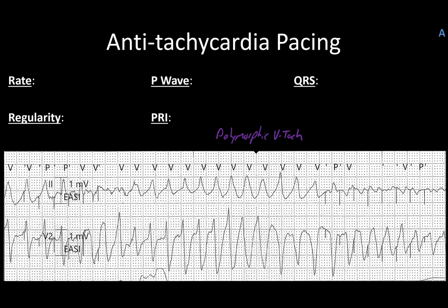What makes this strip important is, and if you go back to the ventricular lecture, you'll see that this is a strip that I used at that time. But you can see that there's pacemaker spikes throughout this. You can't see them in the middle because the amplitude of the waveforms are a little too high for you to see them. It kind of cancels it all out. But this patient has clearly got pacemaker spikes in addition to the ventricular tachycardia that's going on. And we're going to go through and try and suss out all the details.